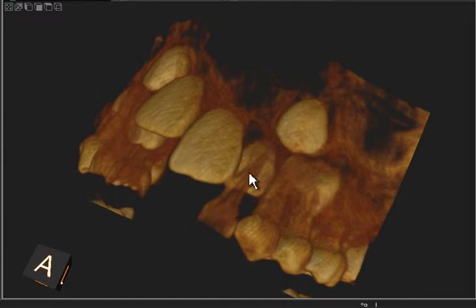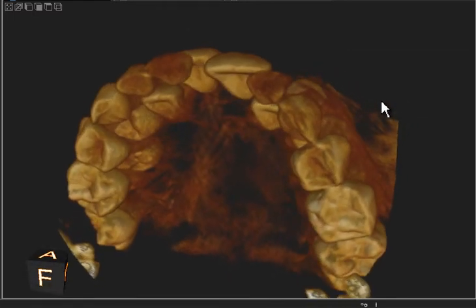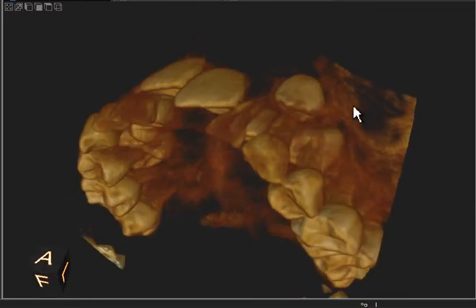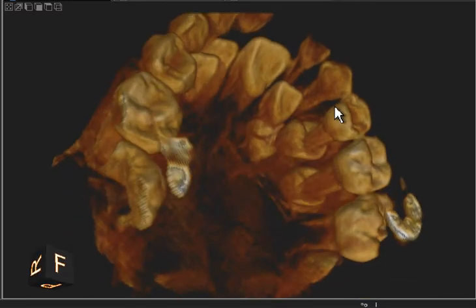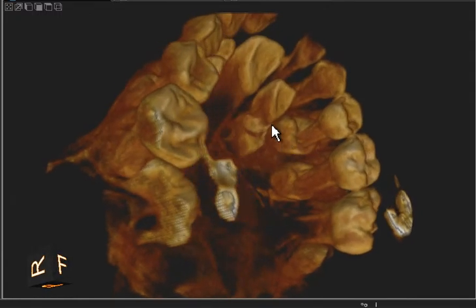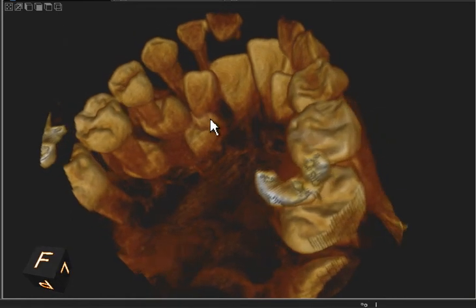As we see, of course, the upper lateral incisor primary teeth have not resorbed because there's no tooth to resorb them. In addition to that, the cuspid is erupting labially. It too has no room to go. If we look at it from different points of view, we can see that it has little chance of achieving any kind of normal position because it's sitting so close to the first bicuspid over here. We can see on the other side the same thing is happening. Here's our cuspid, here's our bicuspid, and our lateral incisor.